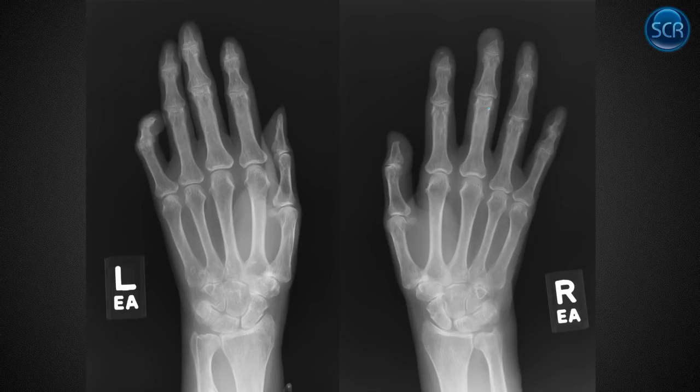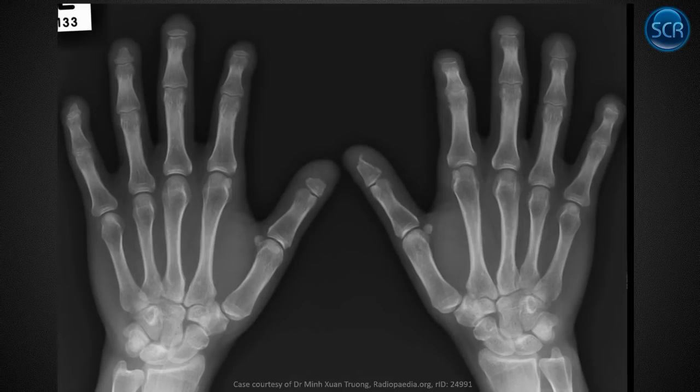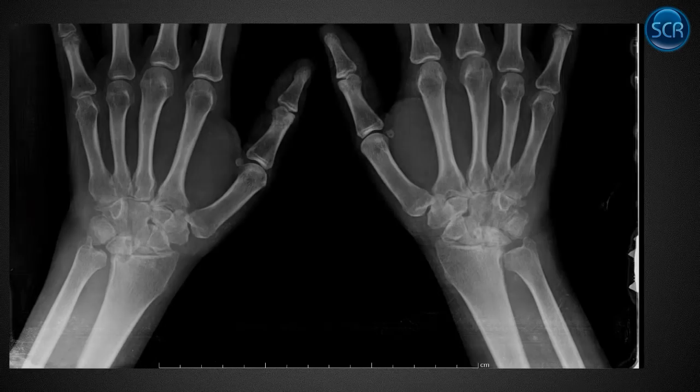The other main differential you should consider for boards when you're talking about acro-osteolysis, where you have resorption of the terminal tufts, is scleroderma. So this is a patient with scleroderma where they have resorption of the terminal tufts because their skin is becoming tight and leathery at the tips, causing resorption. They also have some other arthritic change here at the fifth tip. Here's just another example of acro-osteolysis in someone with scleroderma from Radiopaedia.